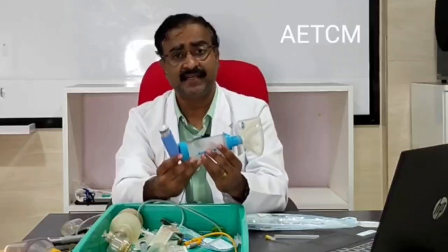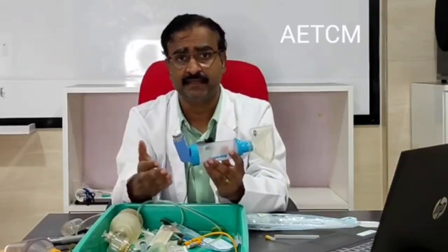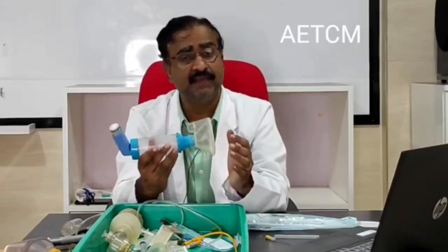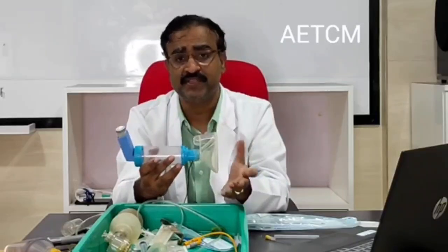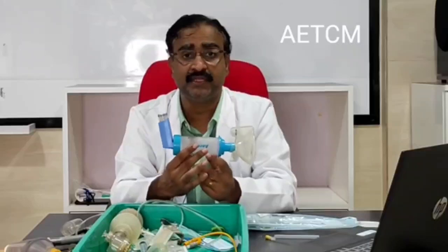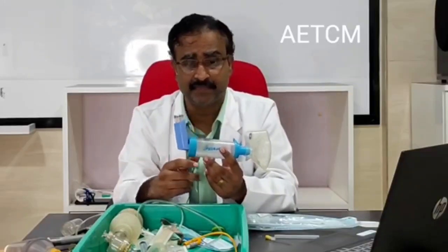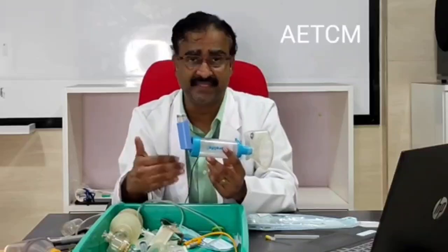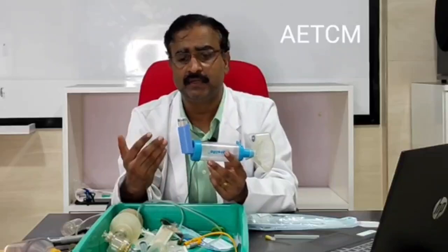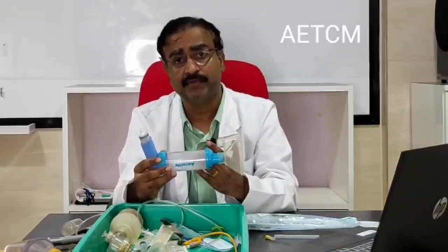So for a young child as small as even a year old to even an older child, even 5 years, 10 years, 12 years, yes, you can use it along with the spacer and the mask. In fact, it would be safest as an option to advise using a spacer and the mask along with the MDI to ensure that the drug that you have prescribed is being delivered and the compliance is good. Else the child will come back with exacerbations and we would be puzzled as to why your therapy has not worked. Again, you can use this even in acute severe asthma.